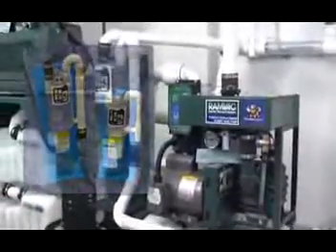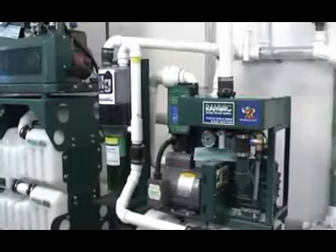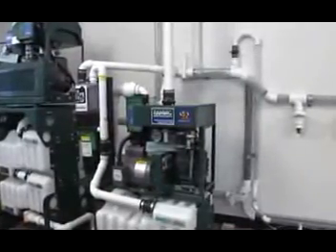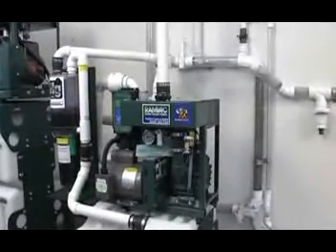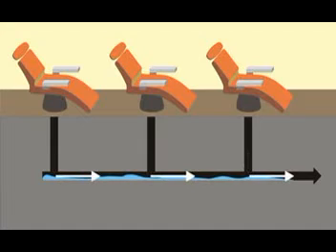Sometimes we get small amounts of liquid that come in, and other times we get large amounts of liquid that come in, depending upon how much air is introduced into the vacuum system from the chairs or the high volume evacuators, which allows the liquid to flow into the amalgam separator and into the collection tank. When you suck up liquid with the HVE, it travels into the trunk line and towards the collection tank. As long as the HVE is open, the air traveling through the trunk line will cause the liquid to continue to flow towards the collection tank.